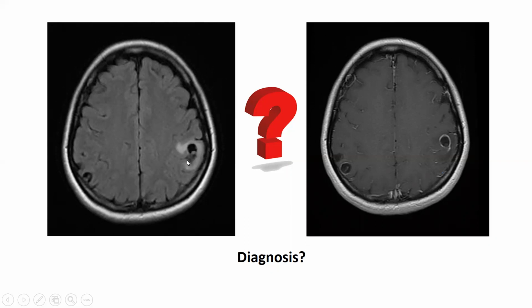No edema is there, sir, on the right side. On the right side you have a ring lesion, and inside there is no edema. Inside, I could see some scolex, sir. Inside you can see scolex. Very good. So there is no edema. And what is the difference between these two lesions? Sir, in the one in the right hemisphere, the enhancement is somewhat less than that in the left hemisphere. Very good.